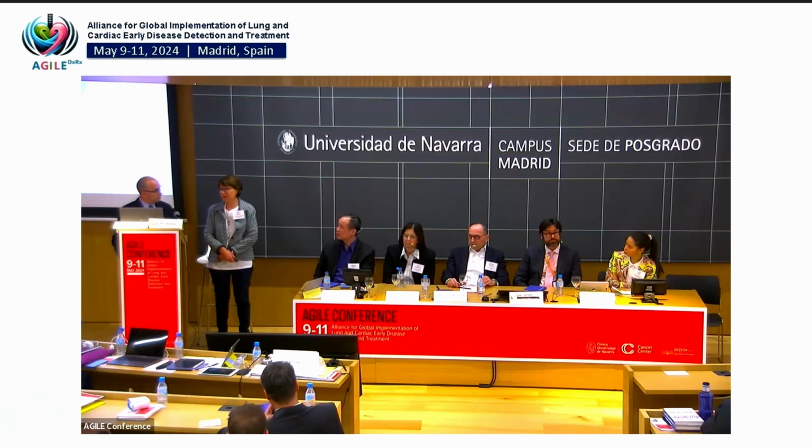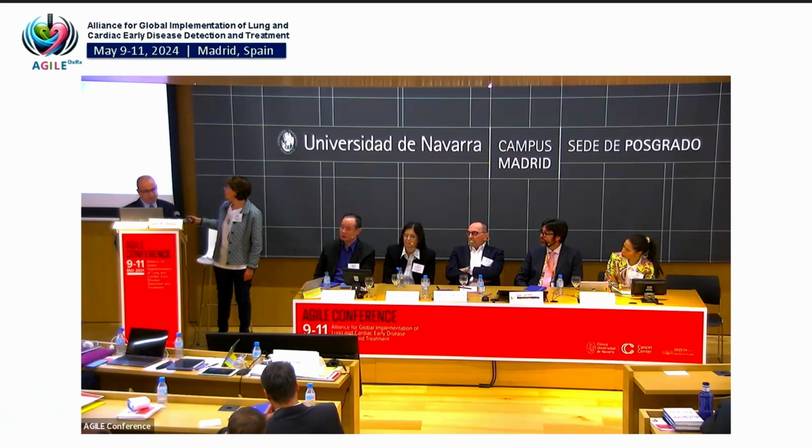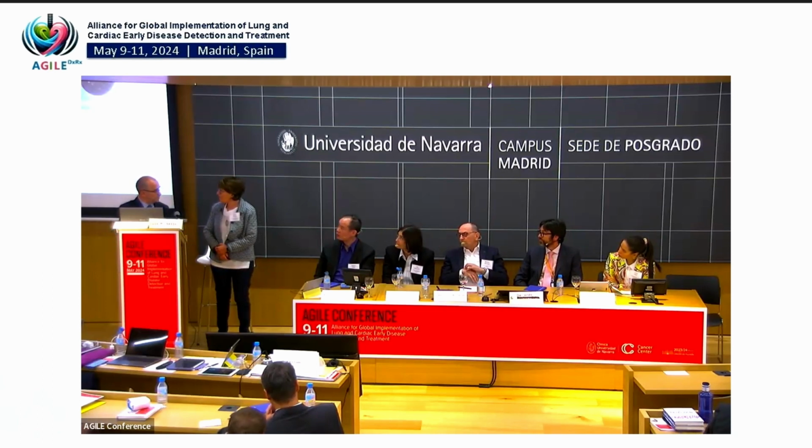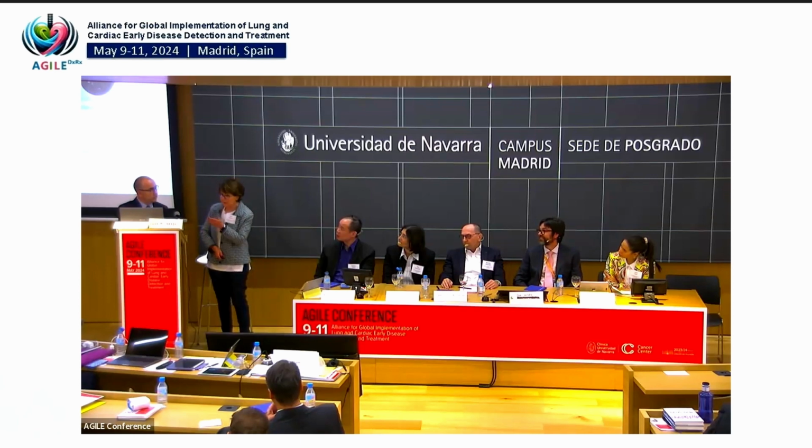Right, and if it's too early, it can still be infectious or inflammatory. So this was my question to Ella, so we already discussed this. Okay. So there was no needle biopsy, is what somebody's asking in the chat. No needle, no bronch, no nothing, in that case. It was adenocarcinoma, and there was a biopsy, but only when the nodule was bigger. Actually, so there was a needle in this one. This is a Mount Sinai case. Yeah. It was cancer. It was adenocarcinoma.